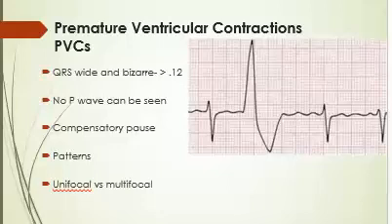And you're like, wait a minute, Shamel, we ain't talk about that. Exactly, that's a PVC. And then there are 2 more regular complexes. If you look at those regular complexes, they have P waves, they have QRS, they have T wave. Everything is looking good, but then you got some goofy little thing in there, and that is a PVC. It is an early ventricular complex, followed by a pause. If you look, there is a little pause before we get to the 3rd beat.